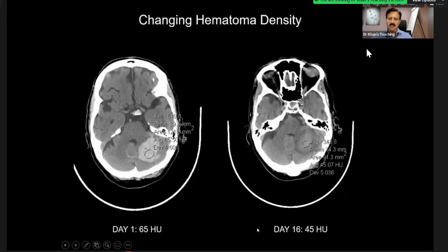So candidate 6, can you now see my screen changing? Hematoma density? Yeah. Okay. So this is a teaching slide. Basically, in trauma, we will go very fast, but the idea is to show you many things. And most of this stuff, you know it. But in the exam, they might show you subtle things which you might not pick up. So this is what I mean by develop your eyes and your thinking about what can be asked in the exam.